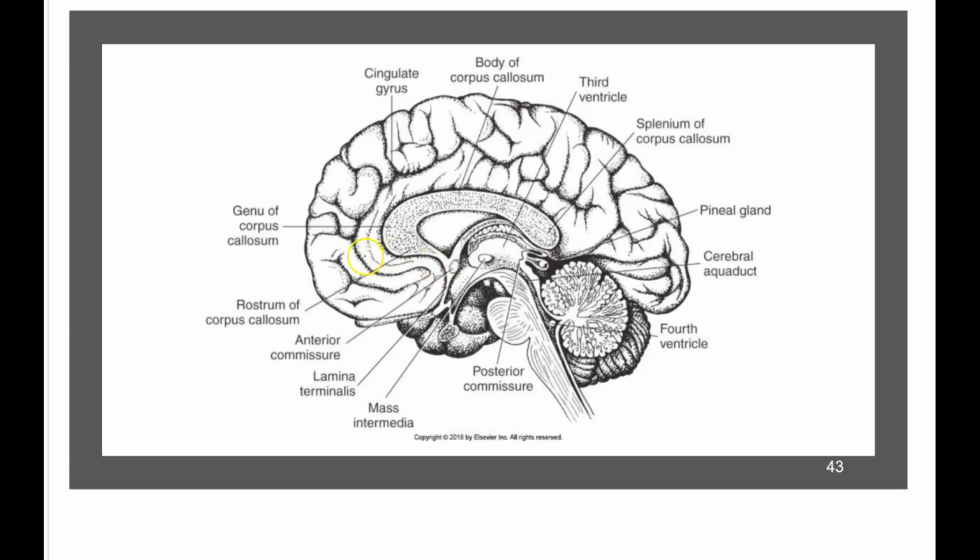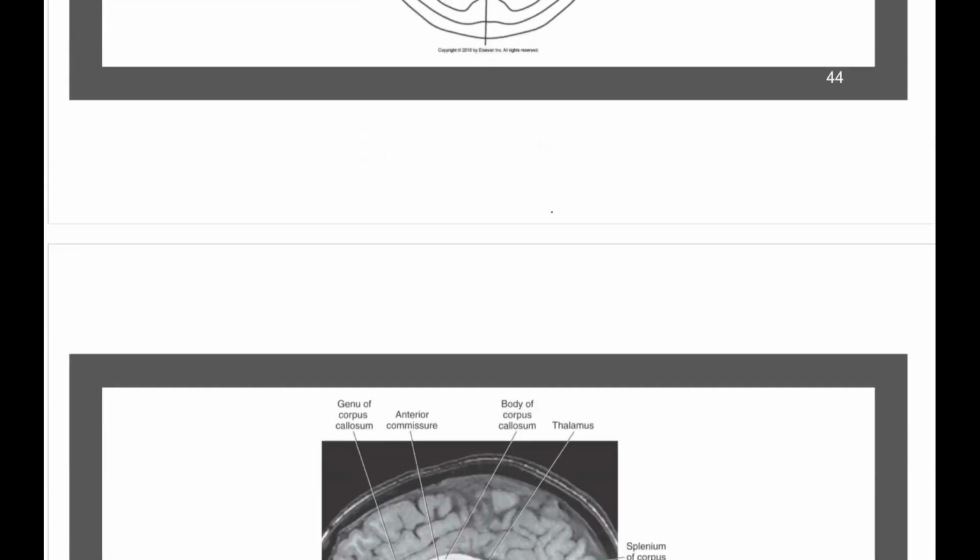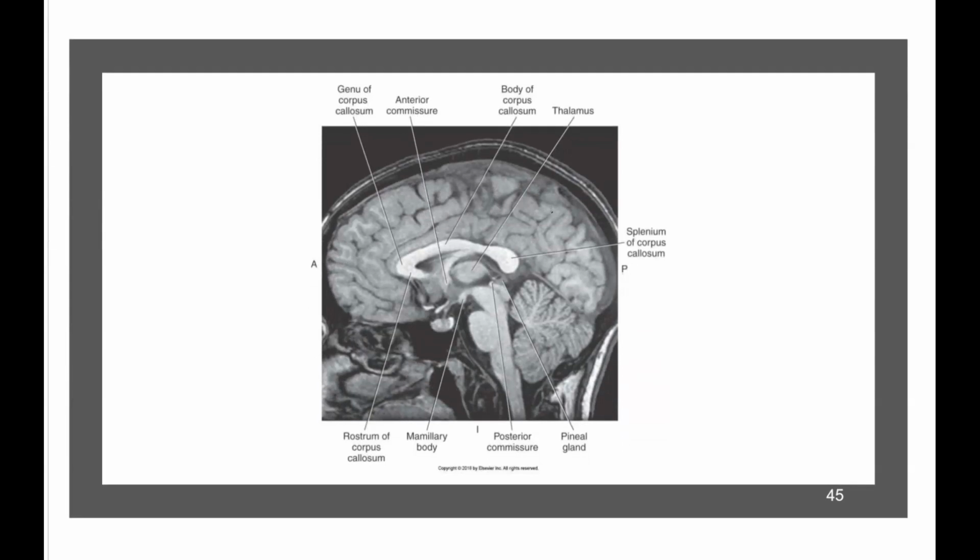And I want to cover the cingulate gyrus. So it's just along the corpus callosum. It just runs right along it. Okay. I don't want you guys to get too hung up on that. So here's midline. Let's take a look at what we got. So it's a good sagittal. This is a Sag T1.